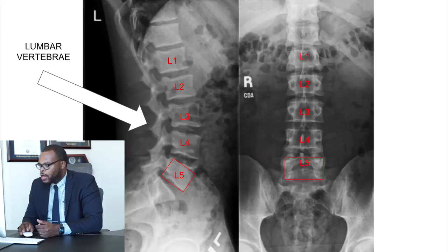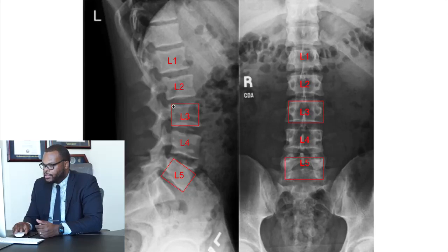This is basically x-rays that are taken when the patient's bending forward and when they're bending backwards, called extension.